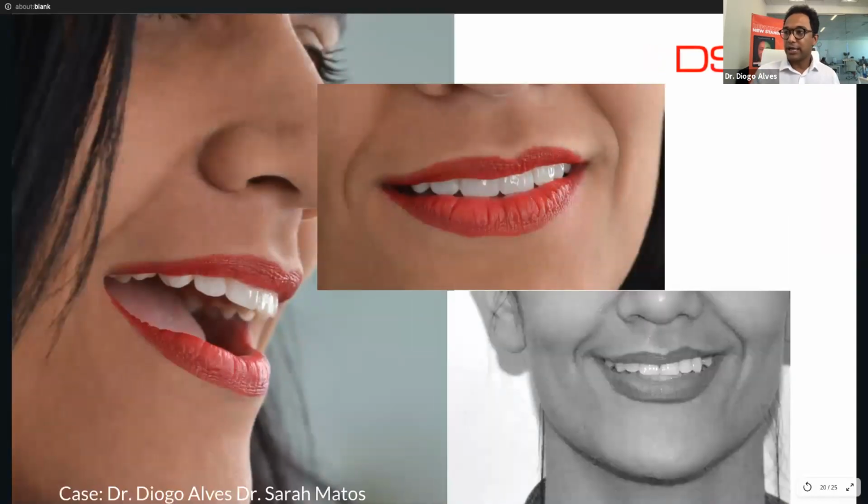Here's another case. Look how natural it looks. This is my case. I did not touch the buccal surface because the app already brings all the natural designs, the natural shapes. So all that I had to do was copy paste and then use the injectable composite veneers technique.